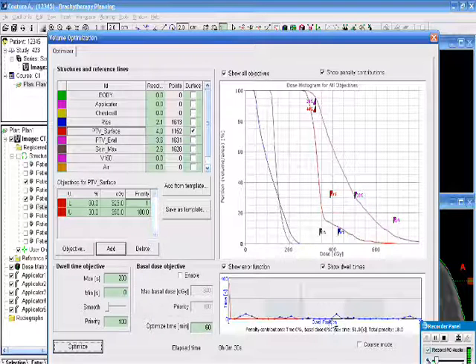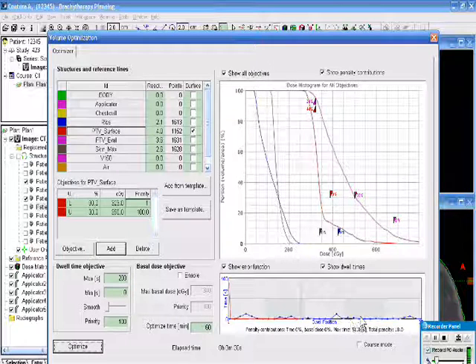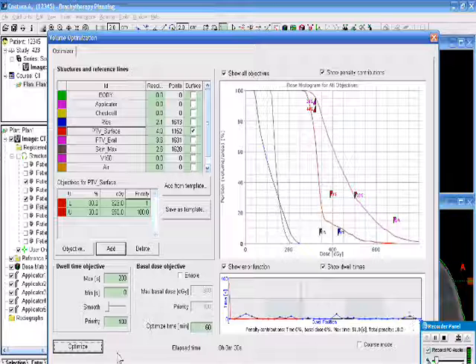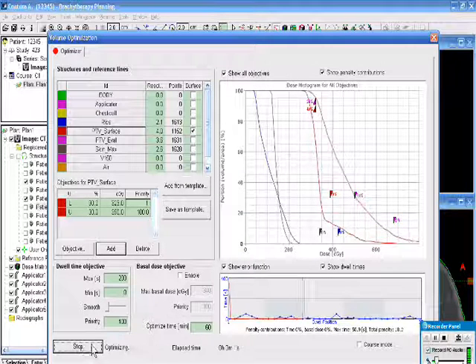This is the one that's toward the chest wall, but up a little bit, and only one position got activated here. This is toward the chest wall and down a little bit, and a few trivial dwell times, and just a little bit in the center channel. So let's look at that in a little bit more detail here. I've got that stopped.